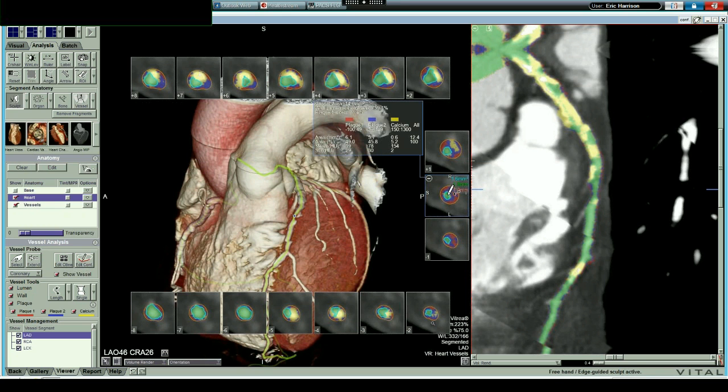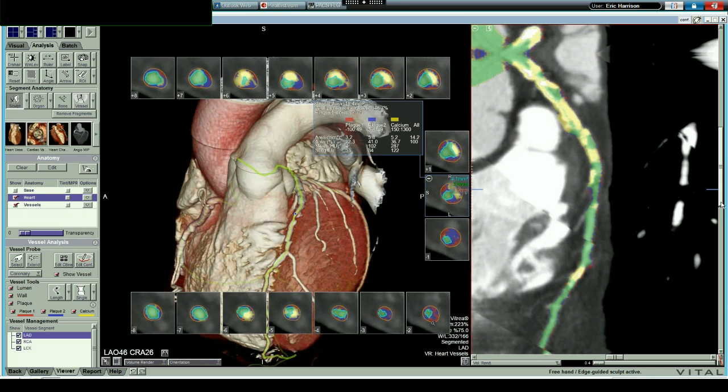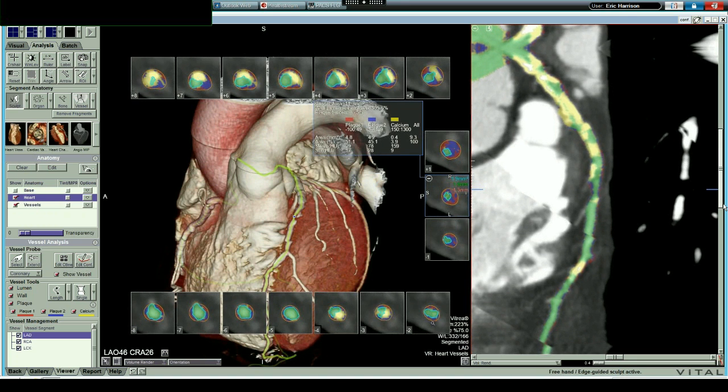And so we like to measure the necrotic core, which is the red, and these are our measurements. And so let's sort of move this up and down until we get it at the most significant plaque. And so you can see an obvious narrowing of the coronary artery, and then you can see obvious calcification on one side, and then we come back and there's calcification distally on the other side, and then the artery expands again.